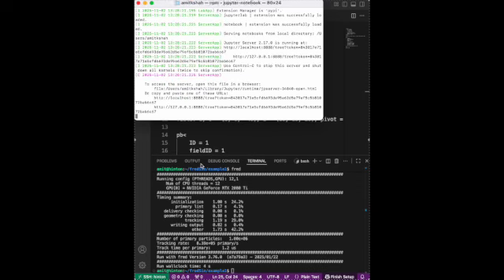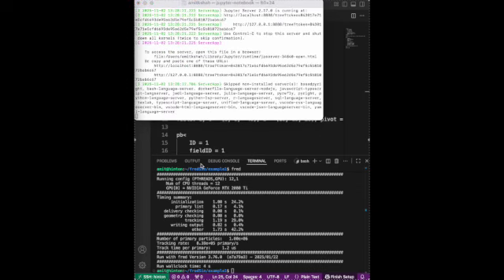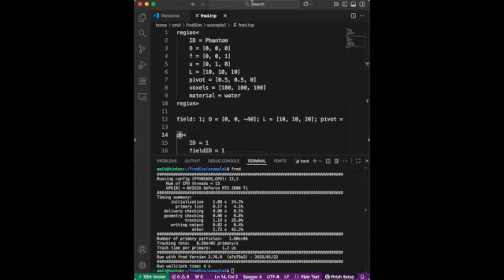So this saves the file at a particular document, which I have saved in my Jupyter notebook code, and I'm not going to write the code.